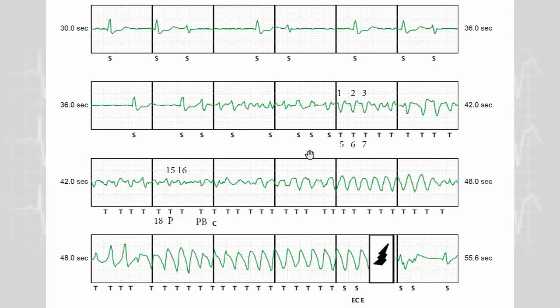The device uses an initial non-programmable 18 of 24 duration criterion prior to onset of capacitor charging. It means that the device will recognize an arrhythmia when 18 of 24 consecutive sensed events exceed the programmed detection zone limit. We will see in other tracings that this counter is automatically adjusted to compensate for double counting and/or noise detection. This counter is seeded with a value of 4 upon initial transition to tachy mode to compensate for the 4 RR average. It means that when you see the first T marker, the counter is already at 5.